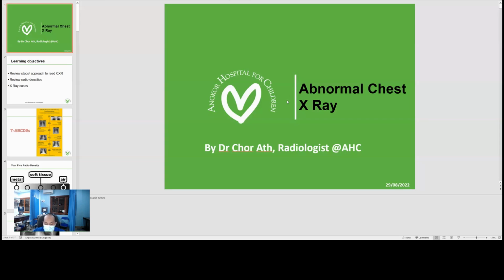Hello everyone, today I'm going to show you about abnormal X-ray. This is a lecture which is followed by the normal reading chest X-ray, or how to interpret chest X-ray. This is the lecture of practice.